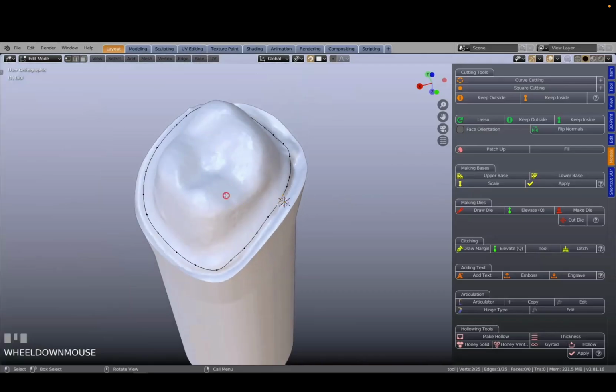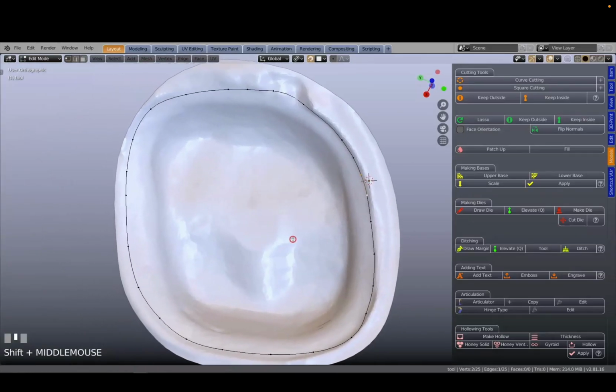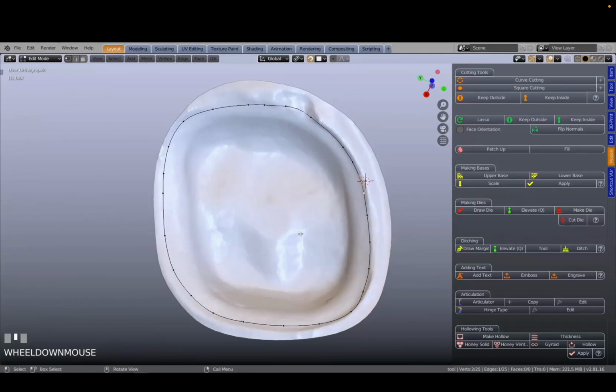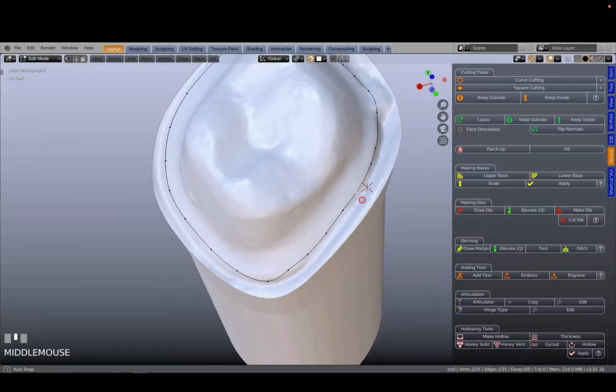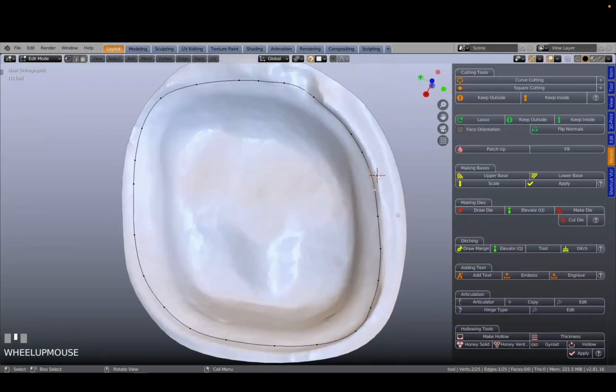Next, rotate the scene, so you can view the die directly from the top. This is very important since the ditching process works in a direction from your current point of view. Ditching a die will not function correctly if you view the die from another angle. The length of the die will need to be viewed with it being parallel to your eyesight. Proceed back to the menu and press on the Tool tab.